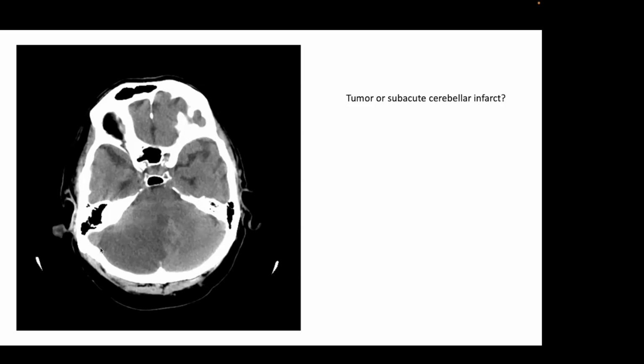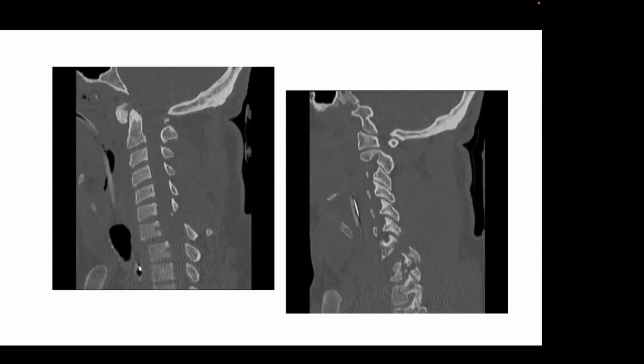And so this often requires surgical decompression. But when you see a case like this, I think your first assessment should not be that you're looking at a tumor. You should think to yourself, could this be a subacute infarct? Because they look very much alike on CT imaging. In that particular case, that was an infarct.